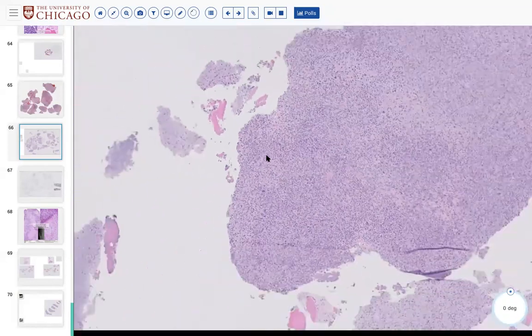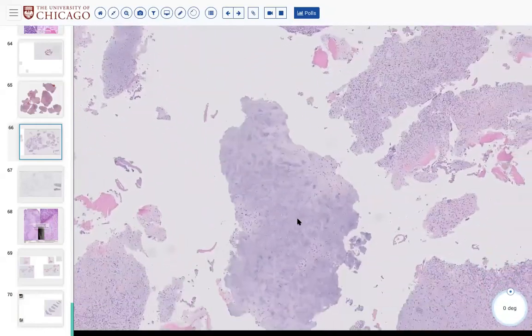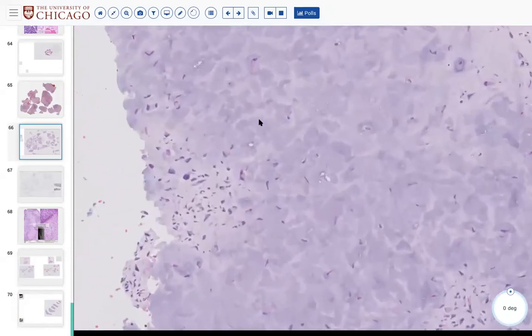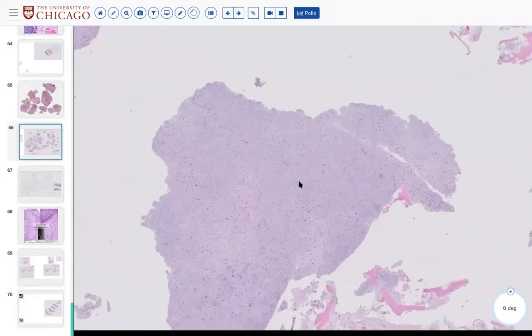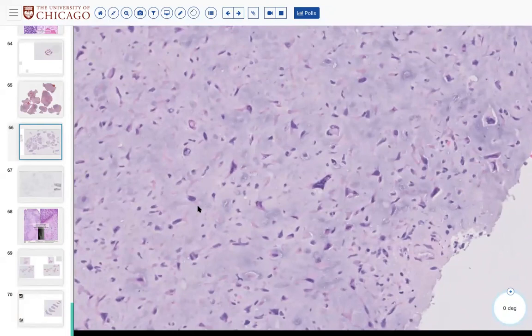Okay, so this is that exact same patient showing slightly more overtly chondroid areas, still with bizarre pleomorphism, also with hyperchromasia, also sent out to consulting pathologists who still call this pseudomalignant. So there you go. That's all I wanted to say about this case.